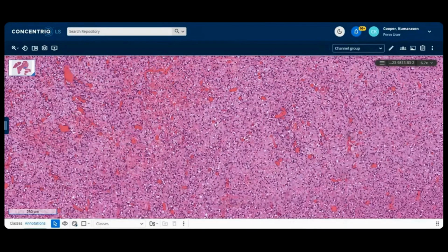So the way to recognize it is spindle cells with this round ovoid look, with collagenous stroma, perivascular hyalinization, and then a combination of CD34 and S100 will help you in that direction. That's why I kept emphasizing that part. So morphological clues, yeah, the stromal collagen and the perivascular hyalinization.